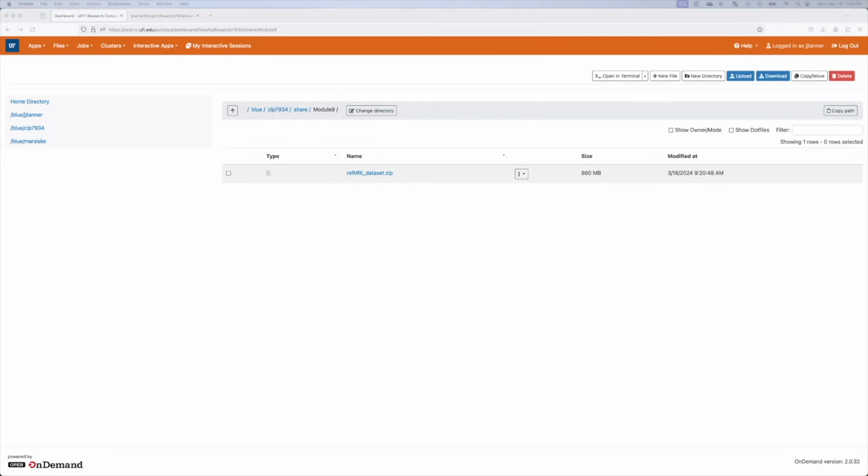I'm going to show you how to process resting state functional MRI data using CONN. So this is lining up with Module 9 for the class. And this is a data set that is publicly available, but we've limited it to 10 control participants and 10 participants who have brain tumors. And we're going to be able to do this analysis. We'll do a very simple analysis.